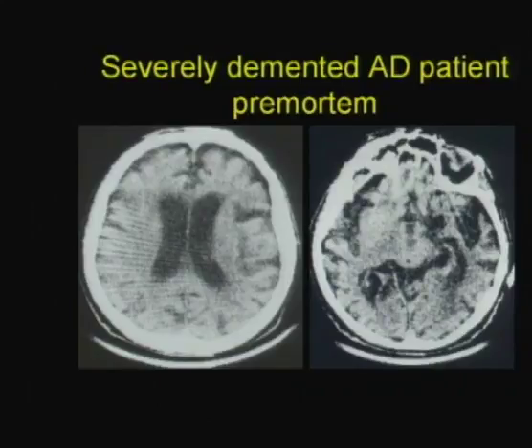She only makes sounds, totally incoherent. The kind of shocking thing, so to speak, is that the ventricles and the sulci at the supratentorial level are not really all that big, are they? But when you look down at the temporal lobe, you see that there is considerable temporal lobe atrophy. The fissures are big, the transverse fissure is big, the temporal horn is big.